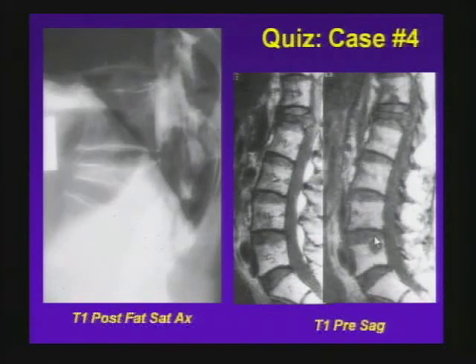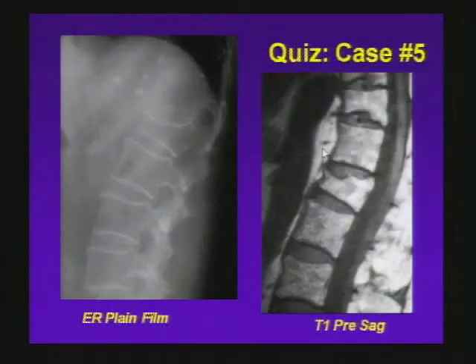Tricky case, because you might say, here's another lesion, but that could be a Schmorl's node. I don't think you can put too much confidence into that one. But look how this thing retropulses back. It has this almost sort of pregnant-looking portion that sticks out into the epidural space and compresses things. There's not a single marrow pixel left of normal fat. Osteoporosis doesn't bulge backward that way. Not a lot of soft tissue changes. This is a neoplasm. Next case.